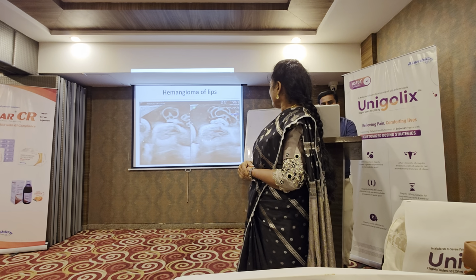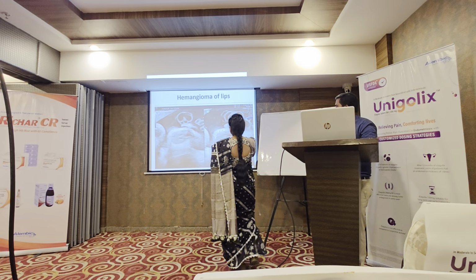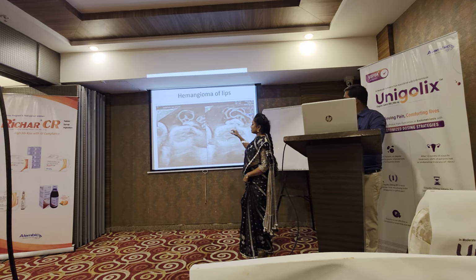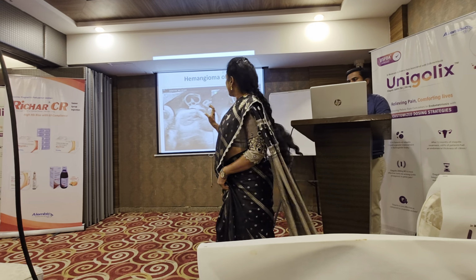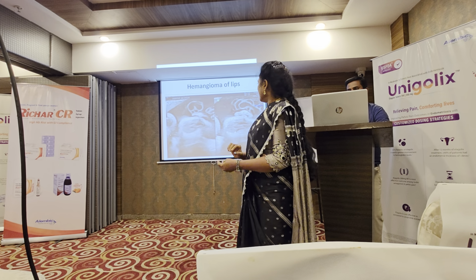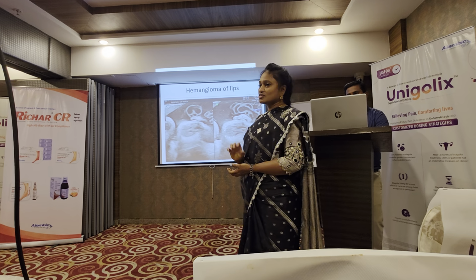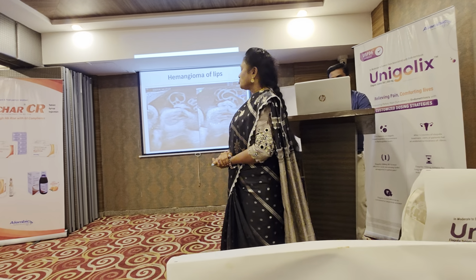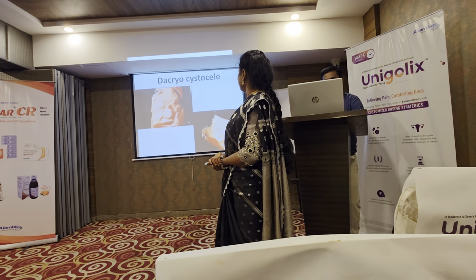Next one. There is a soft tissue mass here. So only in this particular axial section it was visible. In any other section, even the profile, it was not seen. Only in this, that too in the 8th month it was seen. So when we consulted our gurus, they said it most probably is hemangioma. So no need of aborting the baby after delivery. It can be cured.